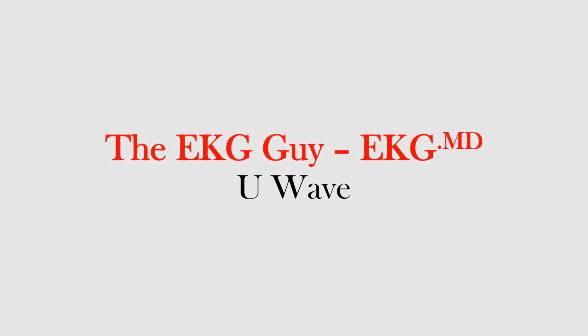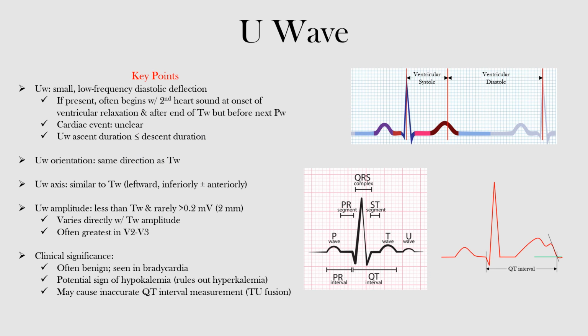In this lecture, we will discuss the U wave, specifically what it represents, how it may appear on the EKG, and its clinical significance. The U wave is a small, low-frequency diastolic deflection that is not always present on the EKG. However, if it is present, it begins with the second heart sound at the onset of ventricular relaxation, that is after the end of the T wave, but before the next P wave.